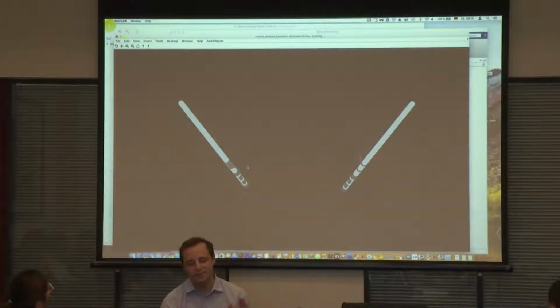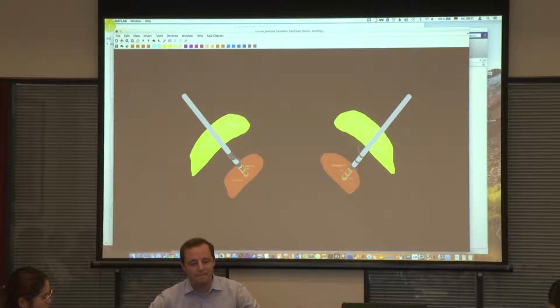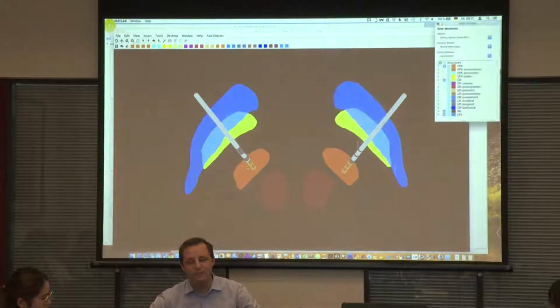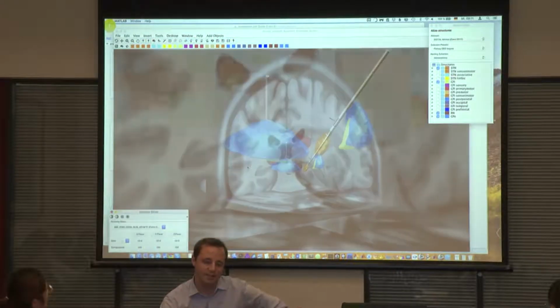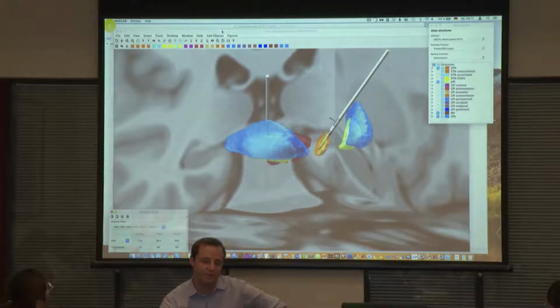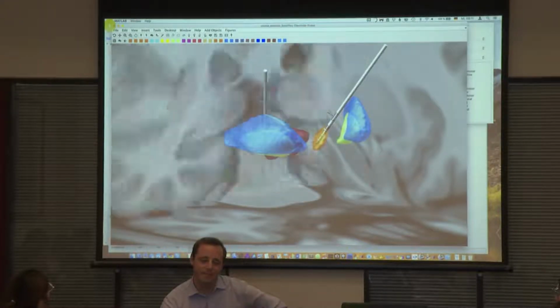And you've seen this before, of course. This is the 3D viewer. But we haven't really covered that well enough, I think. And there are a few things that I wanted to show you. So first of all, very obvious are these anatomical slices that you can just drag around in space.